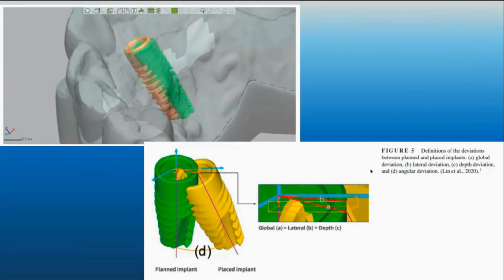So with that in mind, by having the 2 points, contact on the bone, and there's an initial drill that helps to center punch or drill punch that first spot. But as you're drilling, as you go down, there's a potential for about a millimeter of, I'll call it wobble, but a millimeter of trajectory change when it goes in. This is a known fact. And in the planning, we actually have a safety halo around the implant of 1.5 millimeters. We want to have 3 millimeters between 2 implants, or 1.5 millimeters of bone between an implant and the teeth. Otherwise, we can't maintain bone. So that's why this safety zone is there.